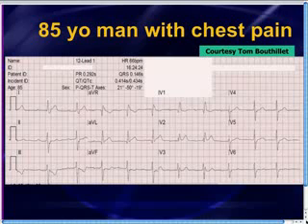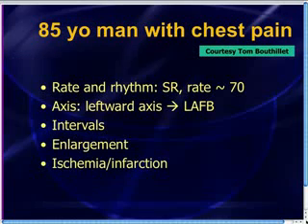There's also the little Q wave and the big R wave in lead 1 and in aVL, little Q wave, big R wave. And in lead 3, you've got the little R wave and the deep S wave. So this patient has, very simple, a left anterior fascicular block as the cause of the leftward axis. Okay, so this is where we are now.